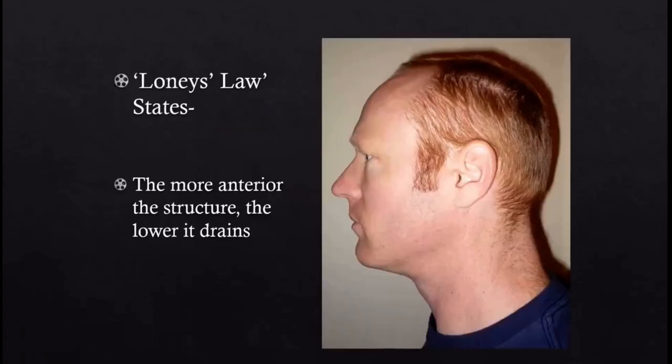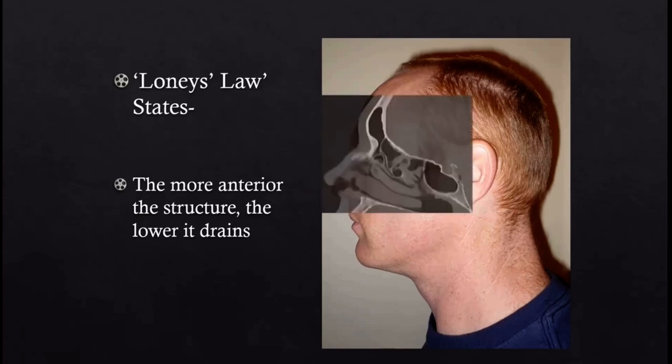So everybody wants to have something named after them, don't they? So I'm going to have a go now at Loney's law, and that says the more anterior the structure is, the lower it drains. So welcome to my long-suffering husband, who often has to have photographs taken of him and then bits of CT scans superimposed on him to block him out.